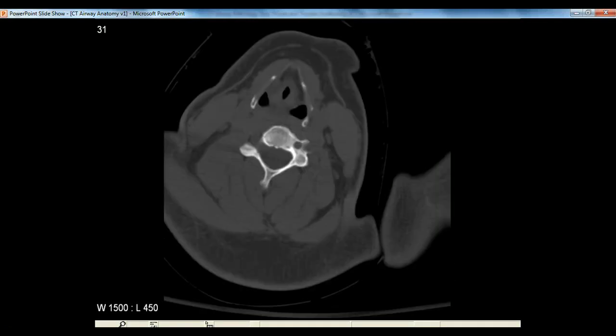Your vocal cords are not cords like guitar cords. What they are are webs of soft tissue, not skin, but soft tissue, that come in from the sides of the laryngeal cartilage. They attach to the laryngeal cartilage along its length in the front. Now you see the laryngeal cartilage is open in the back. Well, your cricoid ring, the next cartilaginous structure down, and we'll see that shortly, looks like a signet ring.